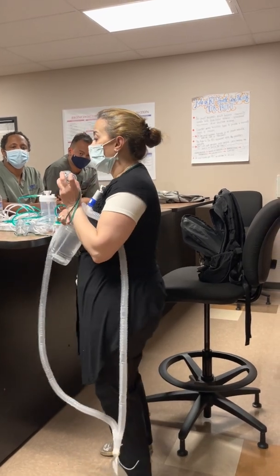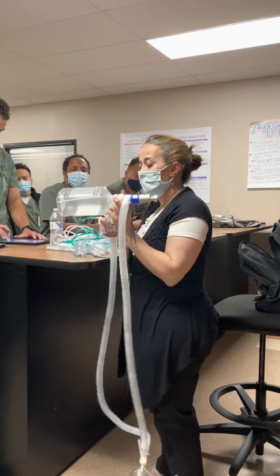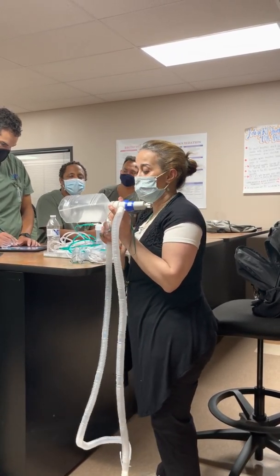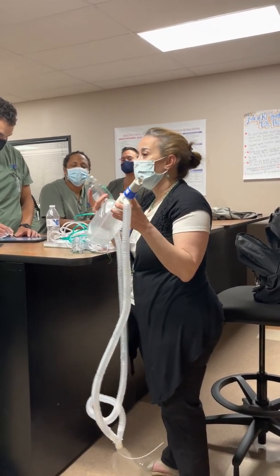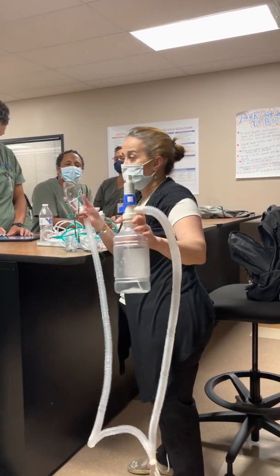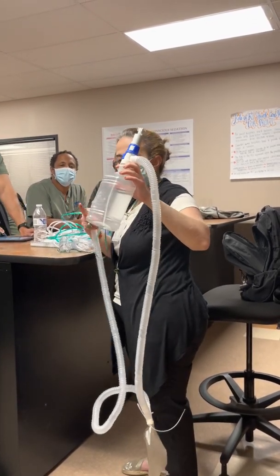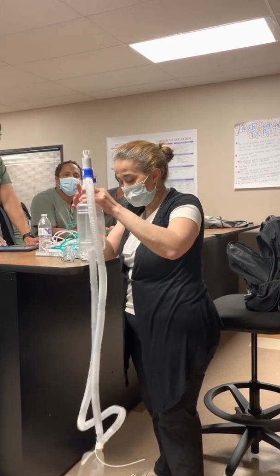We put patient on aerosol after extubation because when they have the tube in the throat, they may have a stridor after. So this helps them. We are not gonna just put them on oxygen. Because of that, we provide aerosol humidification.